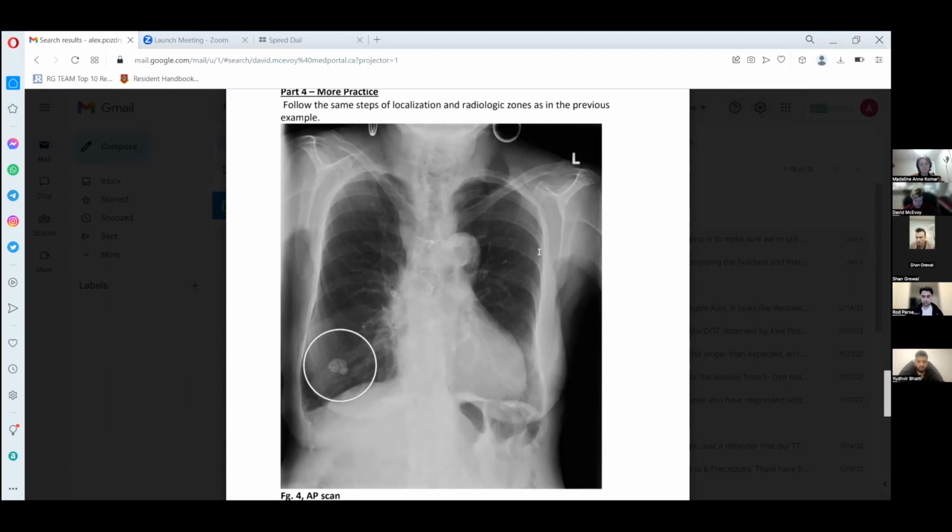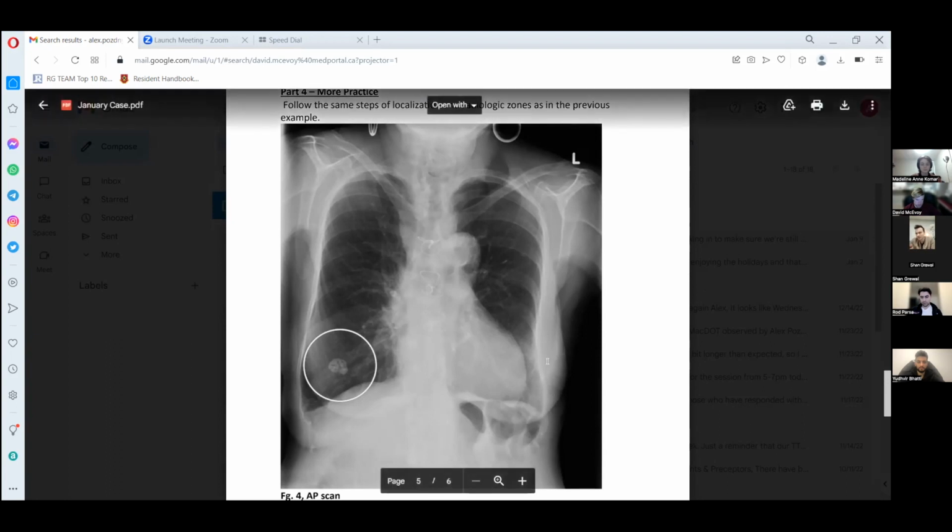It certainly could be, but it also could be that there is lots of fluid in the pericardial sac, so this could be a pericardial effusion with a normal sized heart, or perhaps a dilated heart, not necessarily hypertrophied. So there could be lots of reasons, but all of this can produce cardiomegaly. So the best term to use is cardiomegaly, but it is very good that you noticed this. So it's not actually a real thing, but very good to notice.